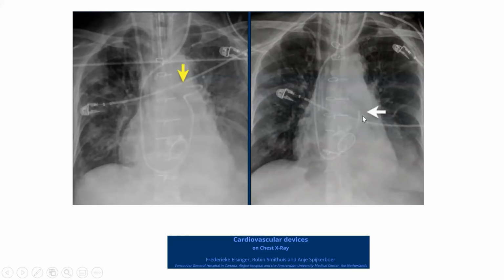You have to pull it back. You position it this way. It has to be relaxed without hooks and kinks. So like this one, it will be in the pulmonary artery, not in the branch pulmonary arteries. So this one has gone too deep. It's pulled back and made straight like this. This is the correct position of the Swan-Ganz catheter.